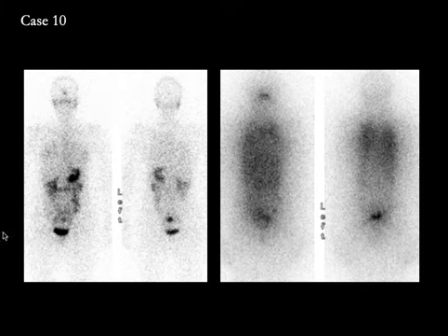Here is an interesting patient where the I-131 scan after thyroidectomy was negative, but their CT scan showed small bilateral miliary pulmonary nodules concerning for metastatic disease from differentiated thyroid cancer. So in this patient, it was decided to treat them with high dose of I-131. We gave them 200 millicuries, and on the delayed post-therapy scan, there is diffuse increased uptake in both lungs, seen best here on the posterior image, with uptake of I-131 seen in those bilateral miliary pulmonary nodules, confirming that they are metastatic disease from I-131, and at the same time treating them with I-131.